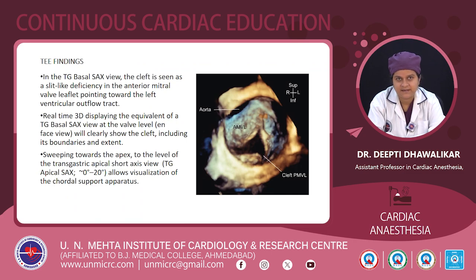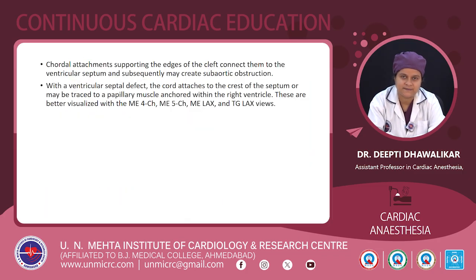TEE findings. In the transgastric basal short axis view, the cleft is seen as a slit-like deficiency in the anterior mitral leaflet pointing towards the LV outflow. Real-time 3D display, displaying the equivalent of transgastric basal short axis view at the level and en face view, will clearly show the cleft, including its boundaries and extent, as shown in the adjacent figure. Sweeping towards the apex to the level of transgastric apical short axis view, this allows visualization of chordal support apparatus.